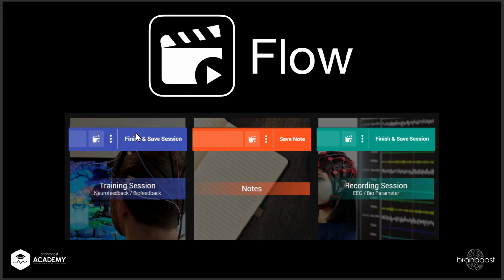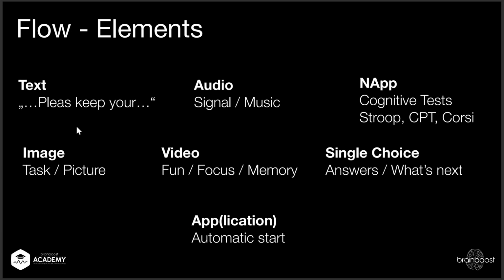Flows, this is the symbol for it. You can do it in a training session, in notes, and in recording sessions, so also with my media device where you don't have access to the raw EEG. But of course, the raw EEG is very interesting to analyze. These are all the elements. Take a look at it and be creative.